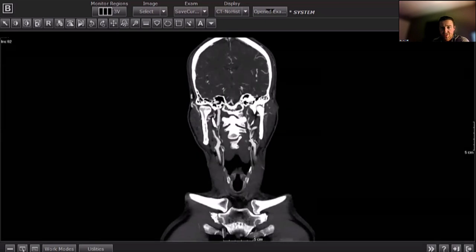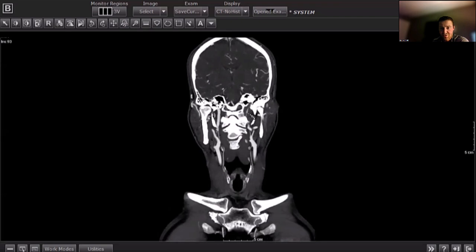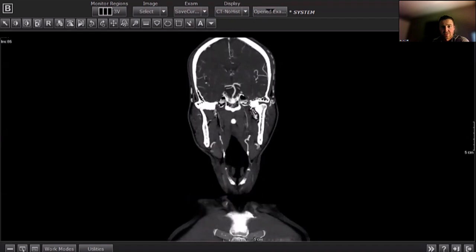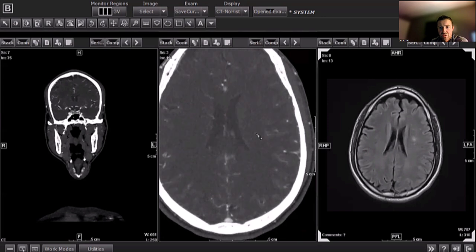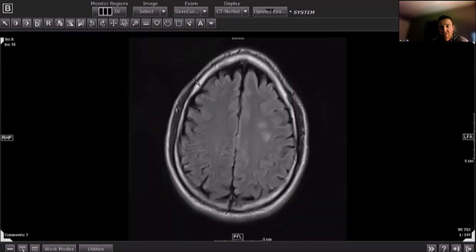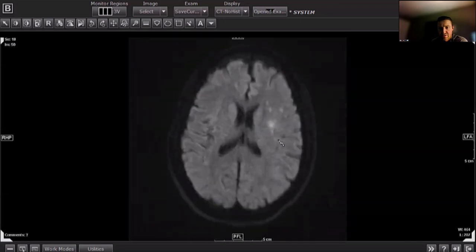On the contralateral side, you can see that beading as well. However, this begins to taper to occlusion at the level of the petrous segment, or distal cervical segment. And then there is reconstitution distally within the petrous. They were, in fact, symptomatic and did end up having small, predominantly watershed infarcts in the left MCA territory.